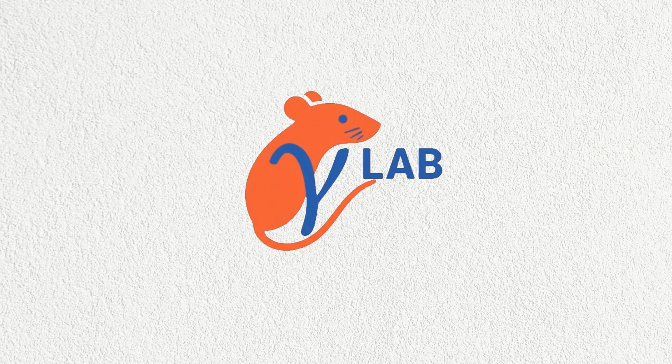This has been an explanatory video showcasing the main functions of GammaLab, the open-source software developed as the graduation project of students Sergio Asencio Rodriguez, Matías Felipe González Valencia, Jorge Esteban Martínez Clavijo, and Giseth Villalobos Rocha at the Pontificia Universidad Javeriana. Long live free science!